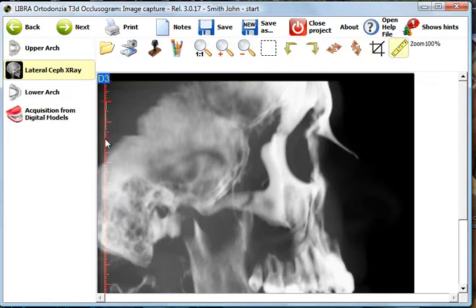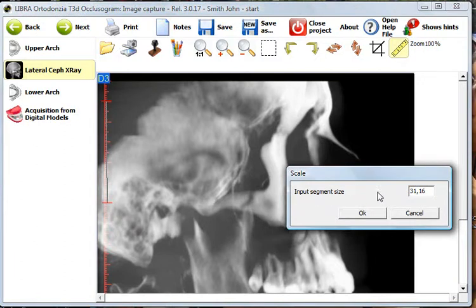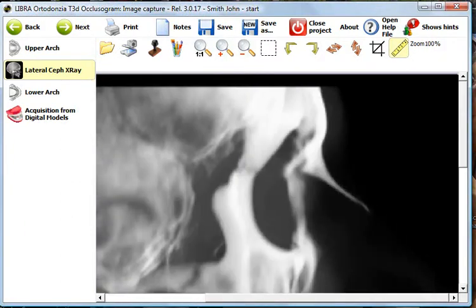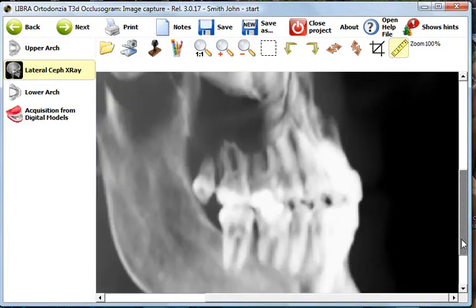click and drag on the reference 3, 4, 5. Whatever you select with this is 50 millimeters. So I say that this distance is about 50 millimeters, and so the image is resized. And this means also that this image has a correct proportion with the digital models.